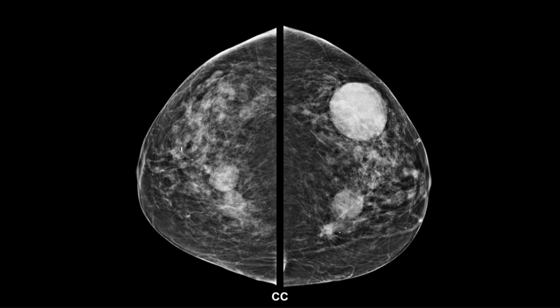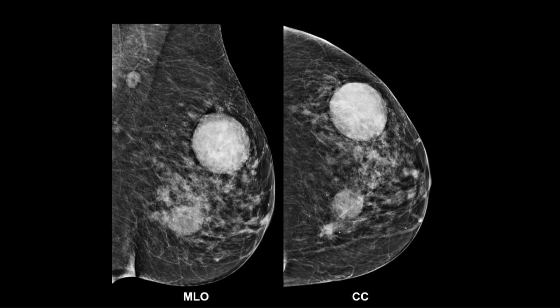That is if, important if, all of them look the same. But if there's one that looks different than all of the others, then that's the one you have to worry about. Okay? Well, in this case, there's something that looks different than all the others. It's not even that subtle.